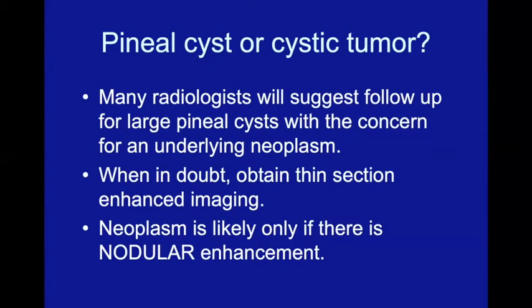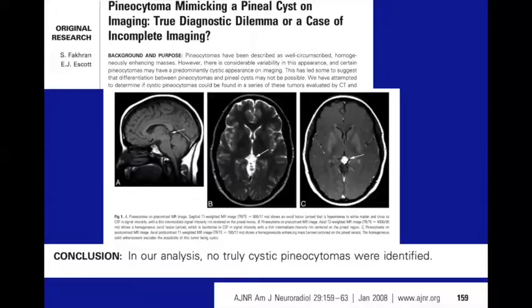So many radiologists will suggest follow-up because of the concern that these cysts will turn into a low-grade neoplasm. When in doubt, just get some thin section imaging, and neoplasm is likely only if there's nodular enhancement. And that was addressed, I think, in this very nice paper talking specifically about this problem of whether a pineocytoma can mimic a pineal cyst, which was published in the literature some years ago.